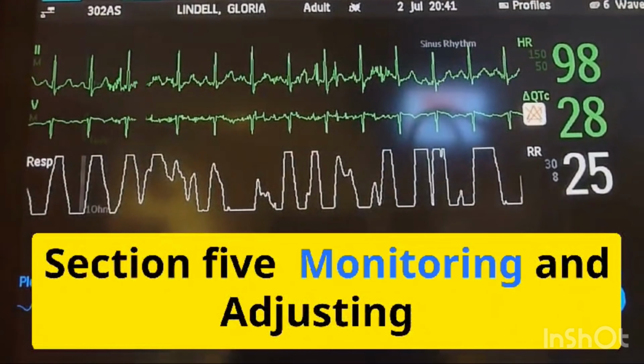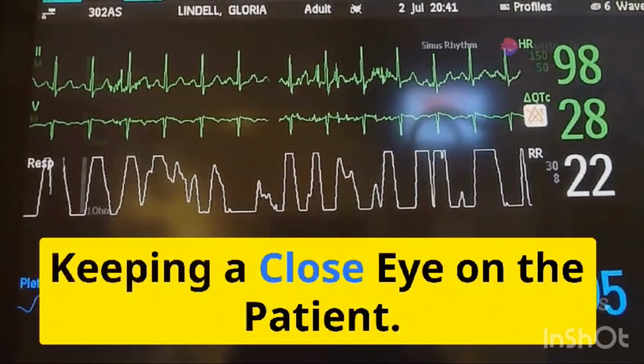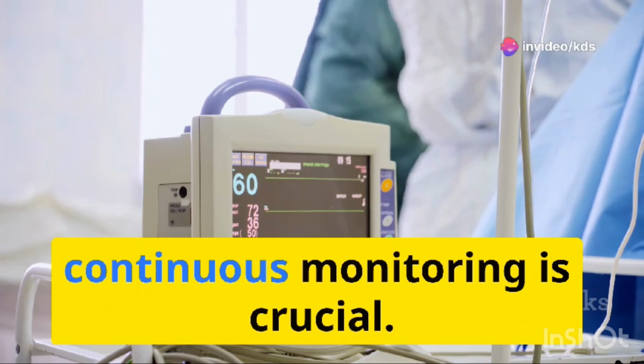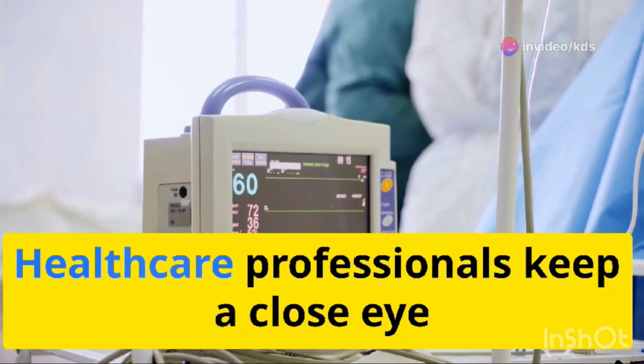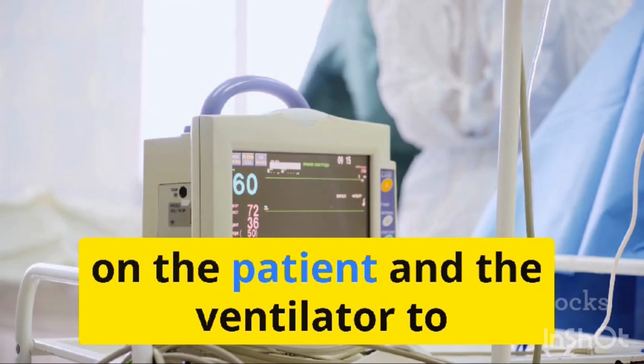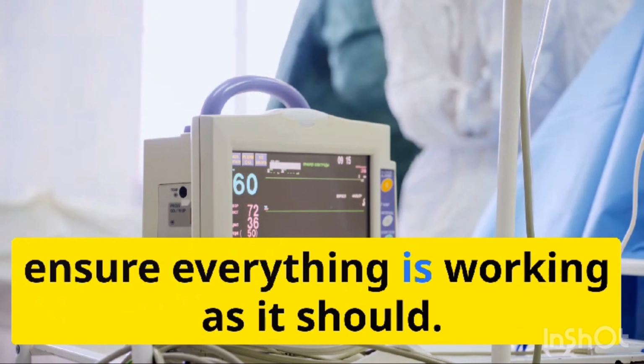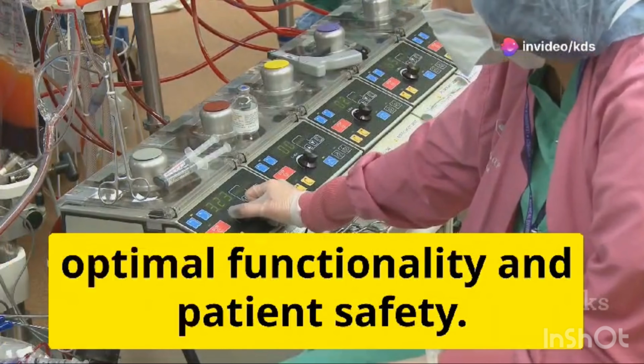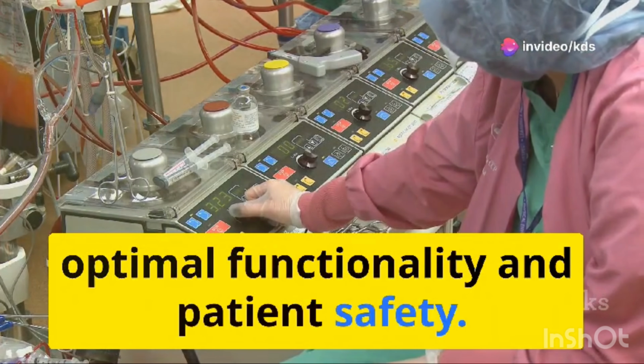Section 5. Monitoring and adjusting, keeping a close eye on the patient. After a ventilator is set up, continuous monitoring is crucial. Healthcare professionals keep a close eye on the patient and the ventilator to ensure everything is working as it should. Regular checks are performed to maintain optimal functionality and patient safety.